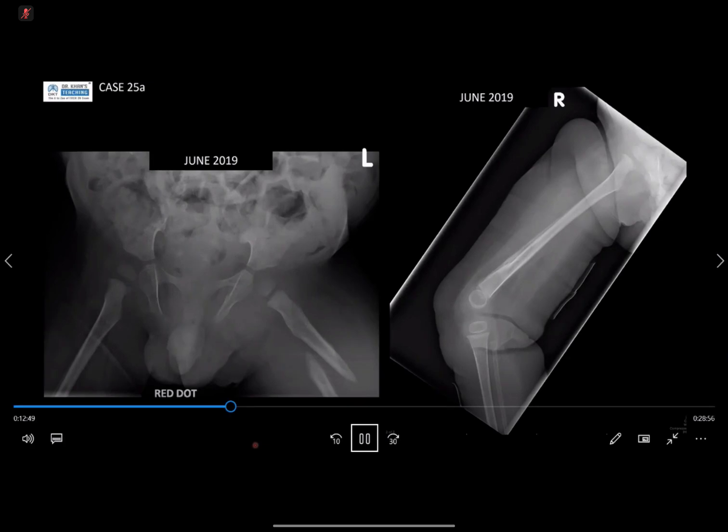This is a frontal radiograph, frog-leg view of the pelvis. I can see that there is an irregular lucent area in the right femoral neck, intertrochanteric region and proximal shaft. There is suggestion of some moth-eaten appearance, suggestive of an aggressive pattern. There is no pathological fracture. There is no extraosseous soft tissue. So this will represent Ewing sarcoma or lymphoma.